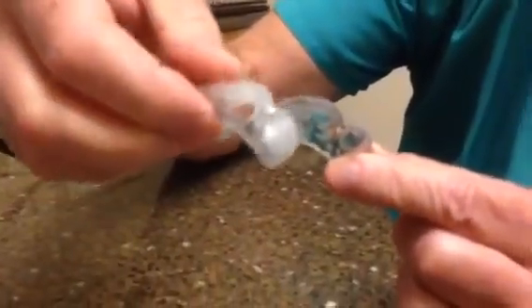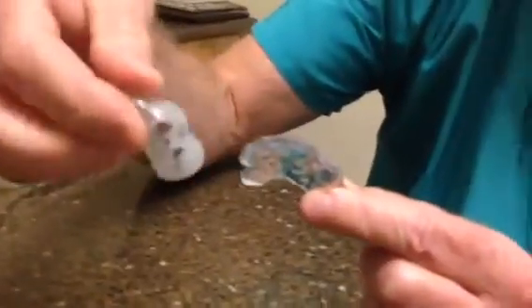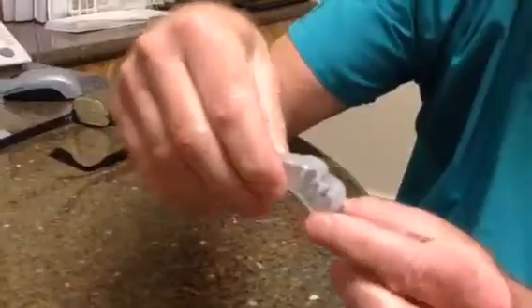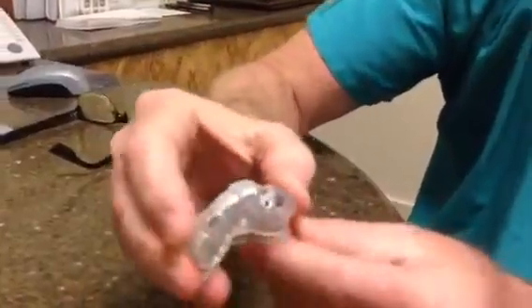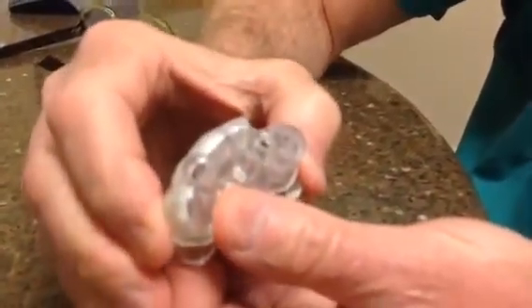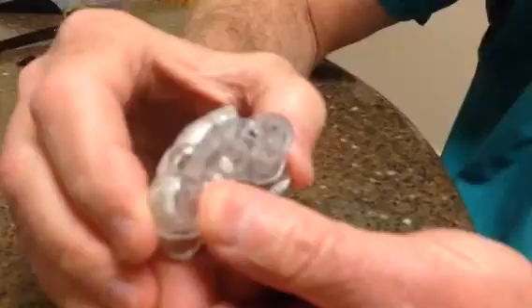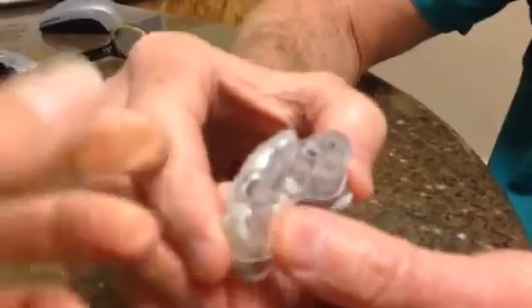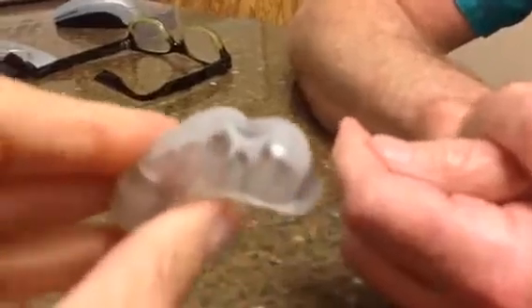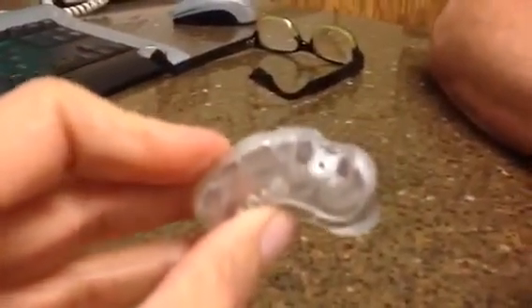This is a surgical guide that was created after we did some computer planning of this case. So this guide just simply fits over the remaining teeth, and then we have a jig and a template, and this little hole here tells us exactly what angle and how deep we're going to need to drill to place this implant, which will replace this missing tooth. And of course this will be sterilized before we use it in anybody's mouth.